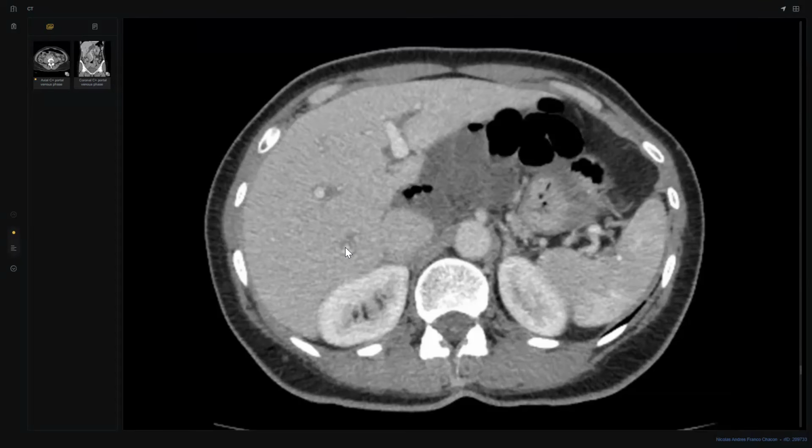What is the relation between the appendectomy and this pathology? Is there any association between this internal hernia and appendectomy? Look again, or give me an explanation.